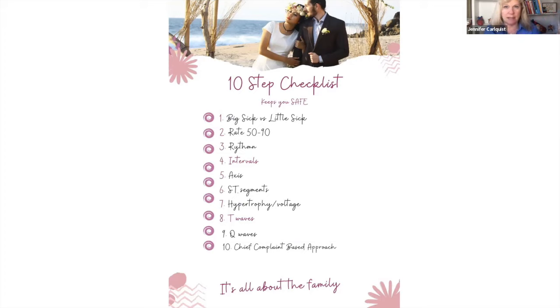The next step is deep diving into your ST segments and looking for any ST elevation or any ST depression. Either one of those should make us take pause and make that straight line across our EKG to really find out if there's a problem, because this is where, if there's a subtle STEMI, you'll pick that up. The next thing is looking at the voltage.